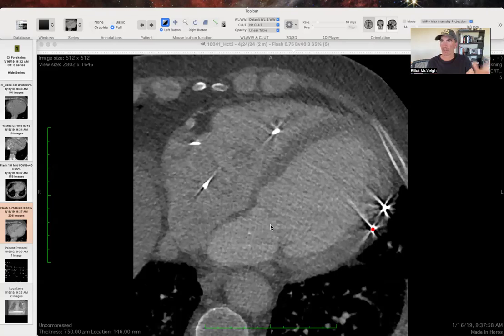And so what we're going to do is we're going to go into Horos. We're going to identify each one of these items. We're going to save those positions into a binary file that Horos writes. Unfortunately, you can't just look at that file with an editor because it has all of this crazy binary info in it. However, there is ASCII text in there that identifies where the 3D coordinates of each lead begin. And so I've written a Python script to go in and find these positions and write them out into a normal Excel file.